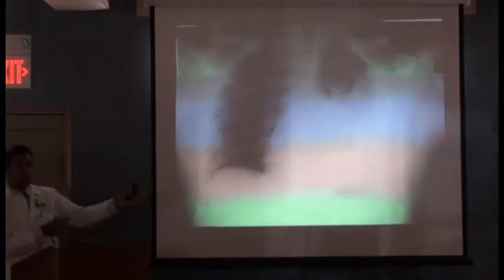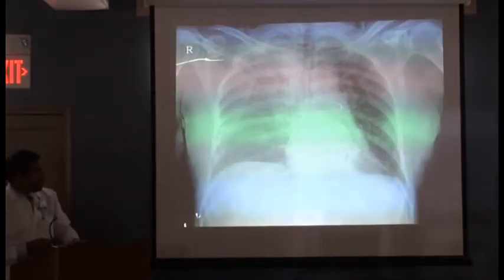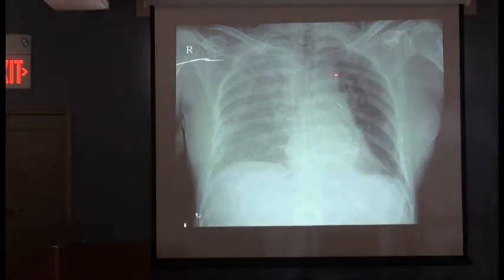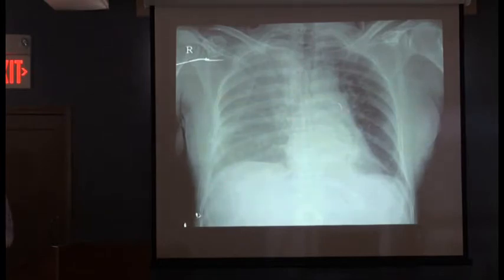All right, so you see all that blood there? So that's probably a hemothorax. Now, I put this on because I want you to see this is very interesting. This is pretty normal here, okay? Do you see the difference? Can I convince you there's a difference? What's going on here? Now, think about this. Remember, when something is brighter on a chest X-ray, it means that there's something in there that's not air. So if there is not as much air being visible on a chest X-ray compared to this side, what's in here?